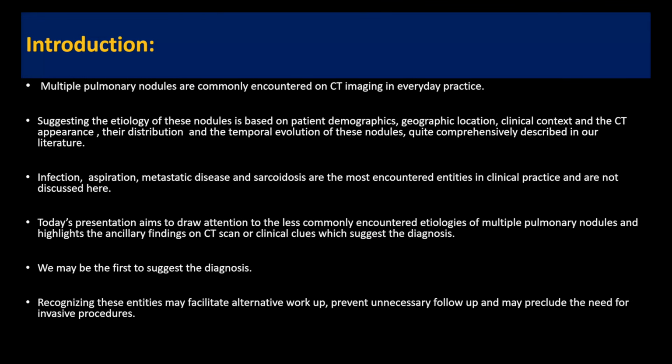So, my aim for today's talk is not to discuss any of these, but to draw attention to the less commonly encountered etiologies of multiple lung nodules while highlighting some of the ancillary CT findings or clinical clues that can guide us towards the diagnosis. What this does is not only facilitate better workup, prevent unnecessary follow up, and also preclude the need for invasive procedures at most times. And we may actually be the first people to suggest the diagnosis.